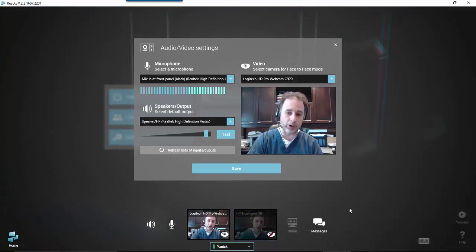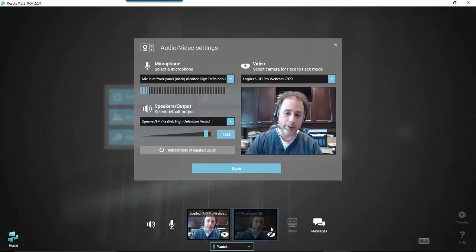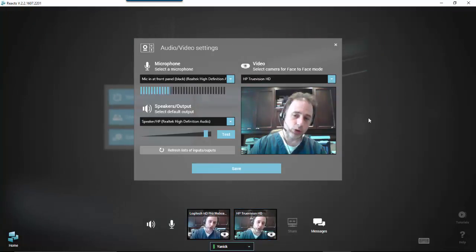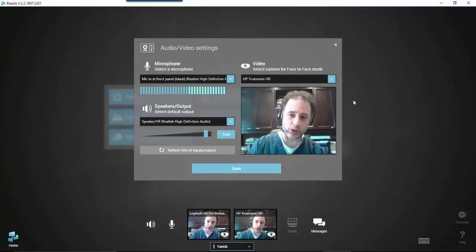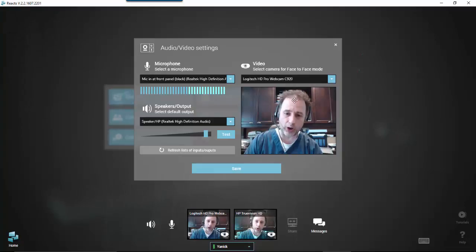By default, the other video feeds are in the off position, but to turn one on, you just have to click on it and it becomes on. Here you can see that I could select that one. I could decide to use my other camera to show something else, and that one would be my face-to-face one. But I always prefer to use my portable one, which has a higher quality.